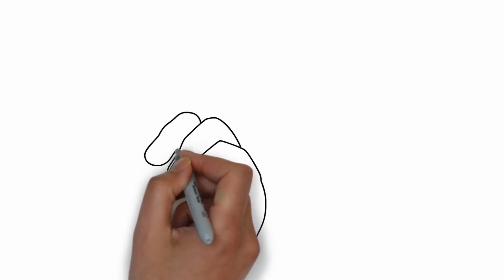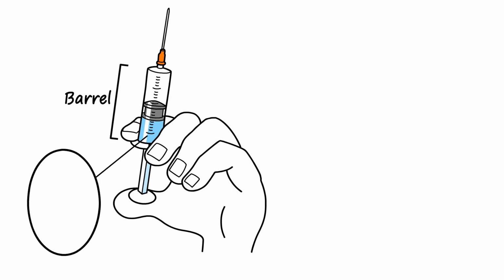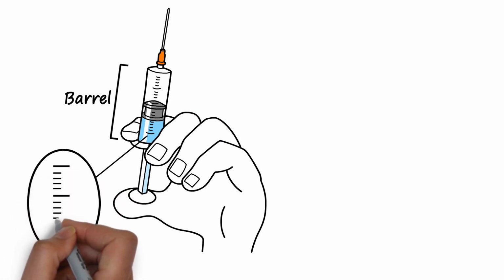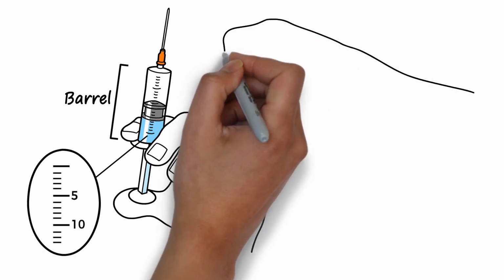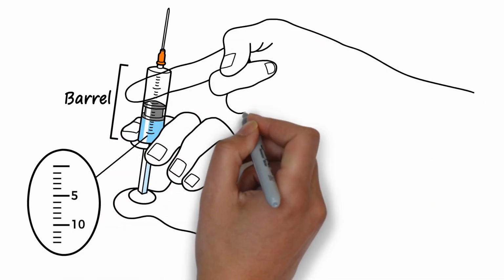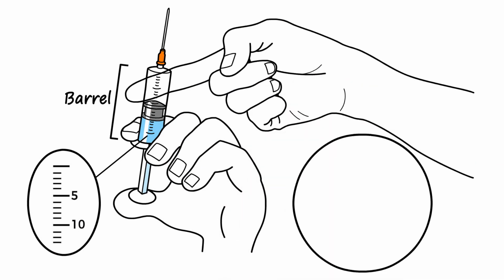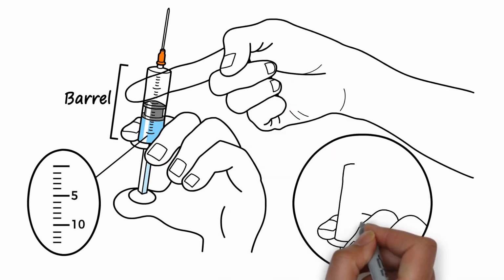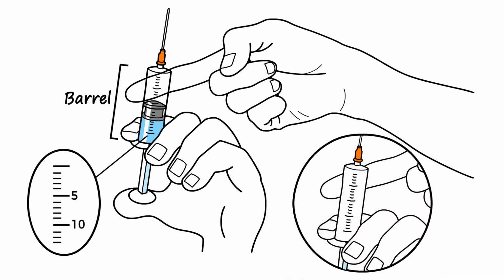The part of the syringe within which the plunger moves is called a barrel. The barrel on common syringes is typically graduated, which means it's marked with accurate volumes for measurement. While most barrels are transparent to allow the user to see the liquid, there are some applications which will require an opaque barrel to prevent the user from seeing the material. This is sometimes requested for light-sensitive applications or clinical trials.